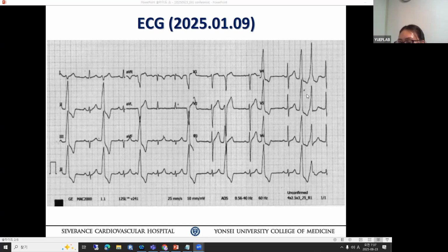Is a possibility one, right? Or the coupling of the PVC is too close, causing a different exit, aberrancy-type behavior. In other words, if you have a PVC focus that fires repeatedly, the first PVC conducts through the peripheral conduction, but the second may not be able to conduct the same way, then exits at a different site. That gives a slightly different morphology as well. It's a matter of refractory tissue conduction. So those are things you need to think about. Okay, so obviously the meaning is different.